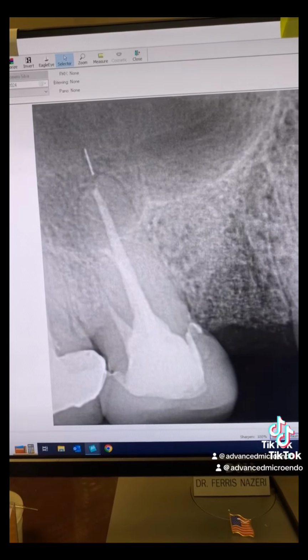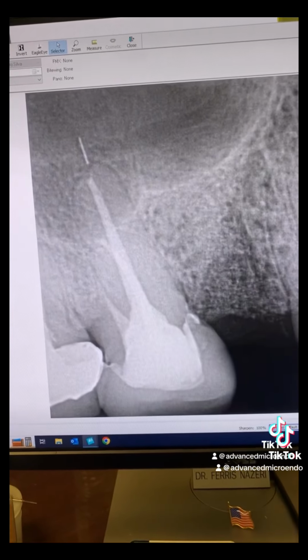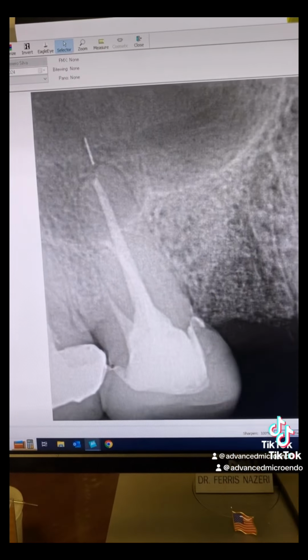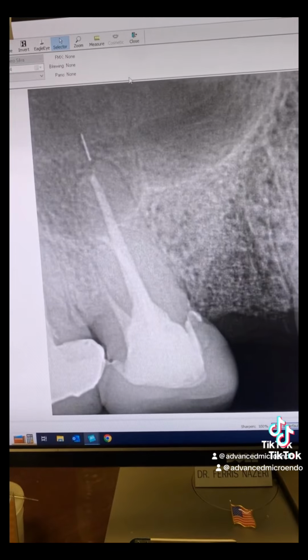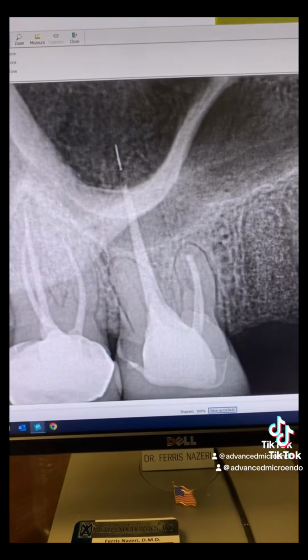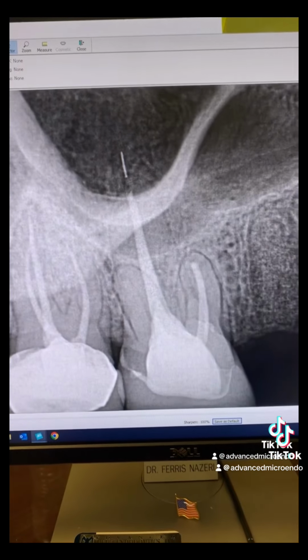All right, so we're not going to do anything about this tooth. We're just going to leave it alone. We'll just make it worse if we decide to do something. I mean, there's no reason. I have no justification to recommend endodontic retreatment on this tooth. Patient has no symptoms and there are no periapical radiolucencies despite all of these mishaps.